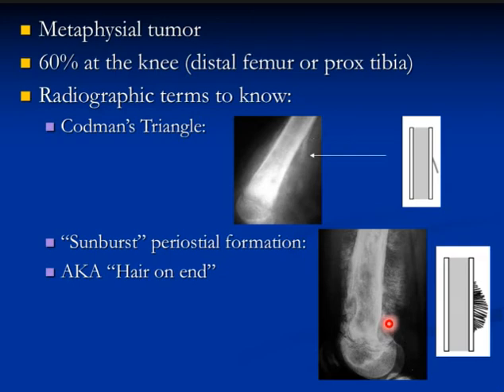Here the cortex is intact. There is no bone destruction. First, this cortex is not normal. It is densely calcified, densely sclerotic, so the cortex is involved first. Second, as we said, osteosarcoma usually presents with sclerotic changes, not lytic changes. So there is no bone destruction, there is bone sclerosis, widening and irregularity, okay?